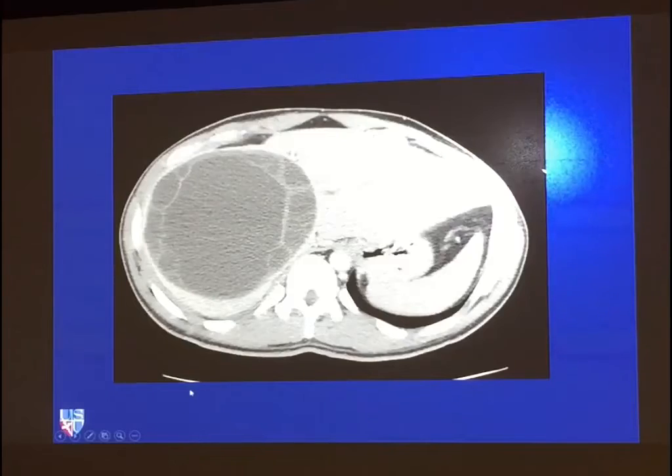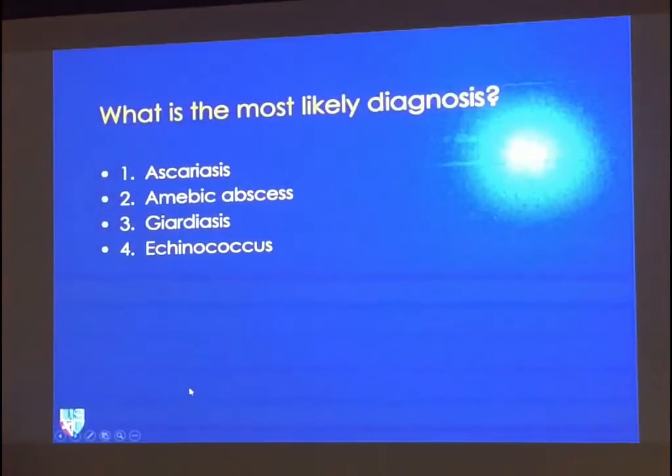Okay. So based on this picture, what do you think the most likely diagnosis is? Does anybody want to be brave enough to shout out an answer? It's okay. All right, perfect.